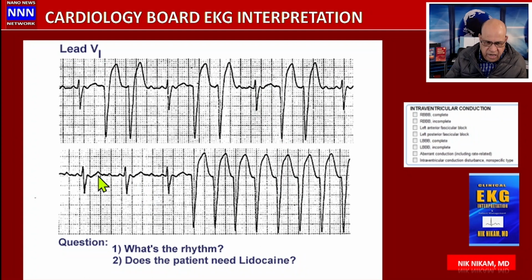So this is atrial flutter, and here we can see a nice 3-beat rhythm strip, followed by a relatively short cycle compared to the previous longer cycle, sets of an aberration which looks like ventricular tachycardia, but this is atrial flutter with variable ventricular response.